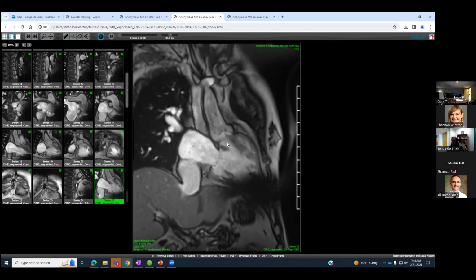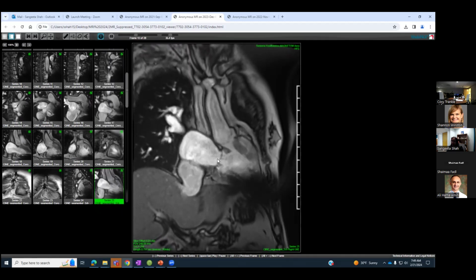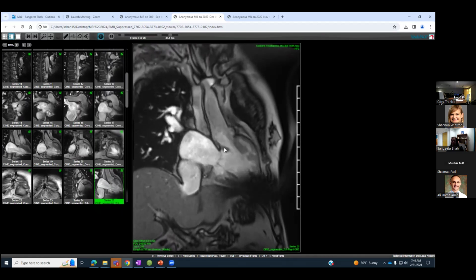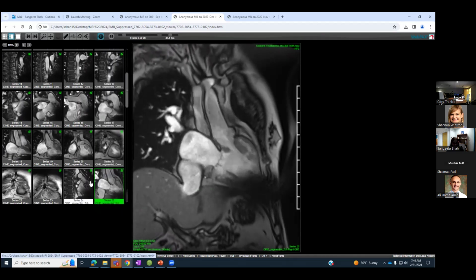Remember, the mitral valve and the aortic valve are always contiguous. When you see this muscle bundle right here, then you have to assume that you have ventricular arterial discordance of some sort for some reason. So always important. As soon as I see this, I know this is systemic RV and this is the aorta. So I just want to highlight that.